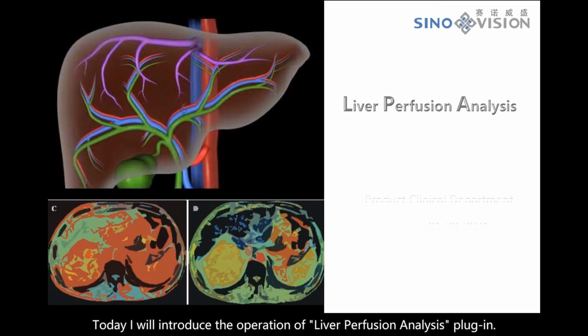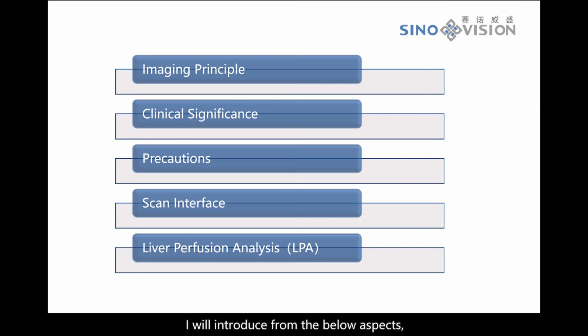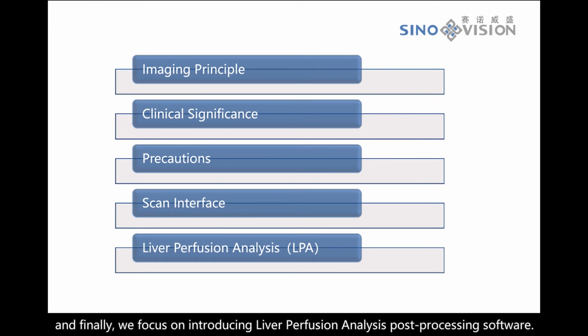Today I will introduce the operation of liver perfusion analysis plugin. I will introduce from the below aspects: liver CT perfusion imaging principles, clinical significance, precautions, scanning interface introduction, and finally, we focus on introducing liver perfusion analysis post-processing software.